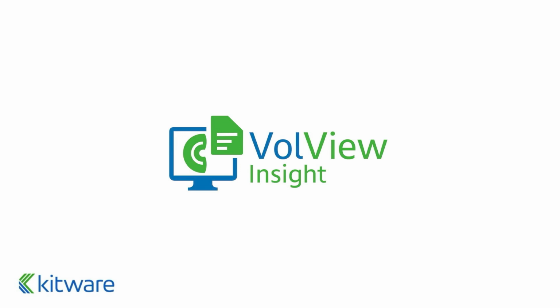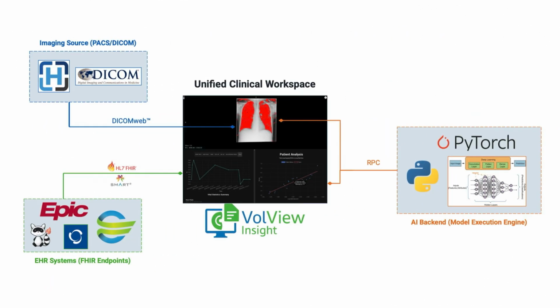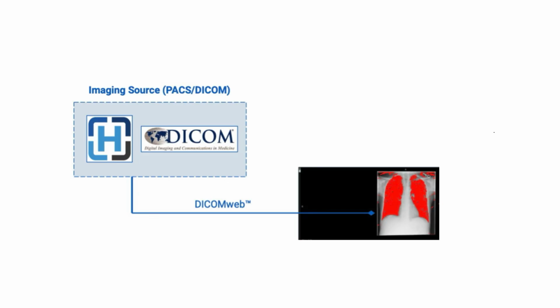Today, the medical team at Kitware would like to introduce VolView Insight, a software platform we've developed to unify imaging and clinical data. The power of VolView Insight is that it provides an integrated platform for clinicians and researchers to interact with medical data. Typically, imaging data is stored separately in a PACS, or Picture Archiving and Communication System, from other types of patient data.